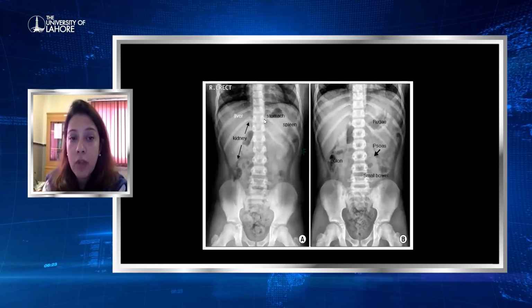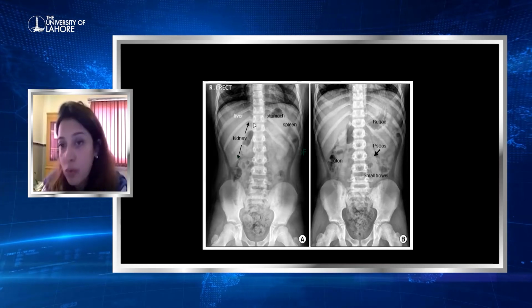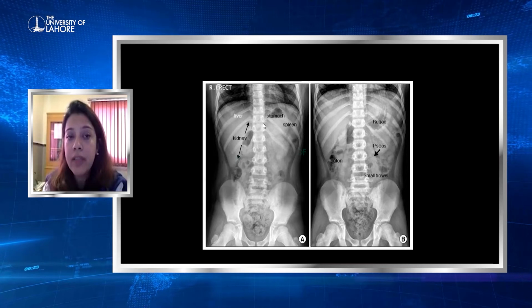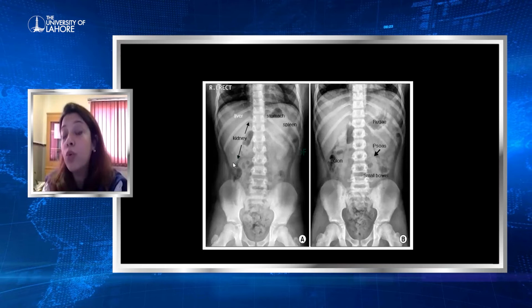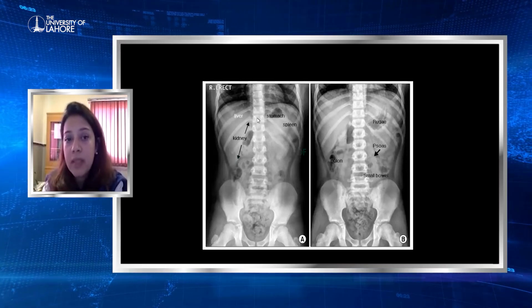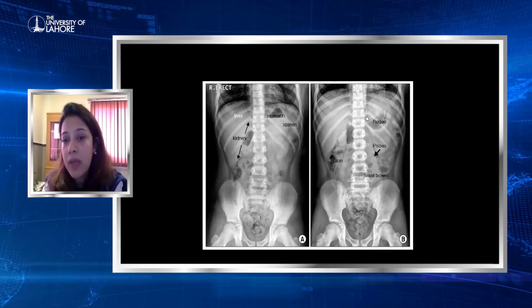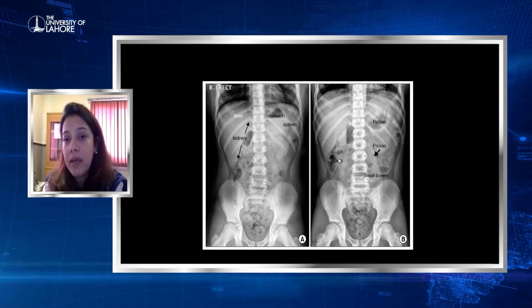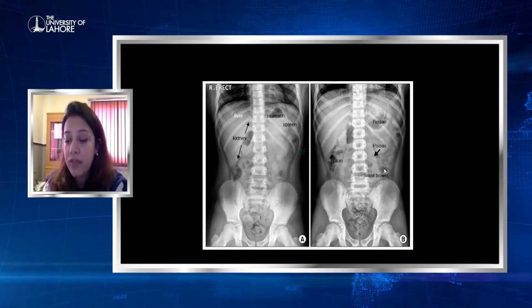Another thing, we also see the shadows of certain organs. Because it's a two-dimensional thing, you can't see the liver properly, but you know that this is the area of the liver under the right hemidiaphragm. And if the patient is very lean and the radiograph is of very good quality, you can see the border. See, this is the lower border of the liver. This is the area of the kidney. This is the psoas muscle outline. Here again, as I've told you before, air in the stomach, air in the colon, air in the small gut. So this is how a normal X-ray abdomen looks like.